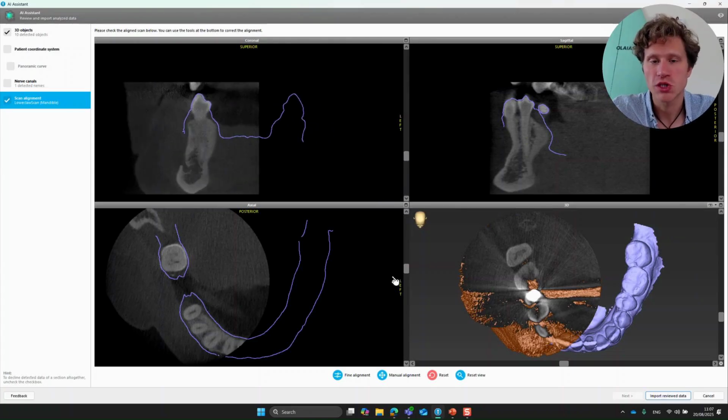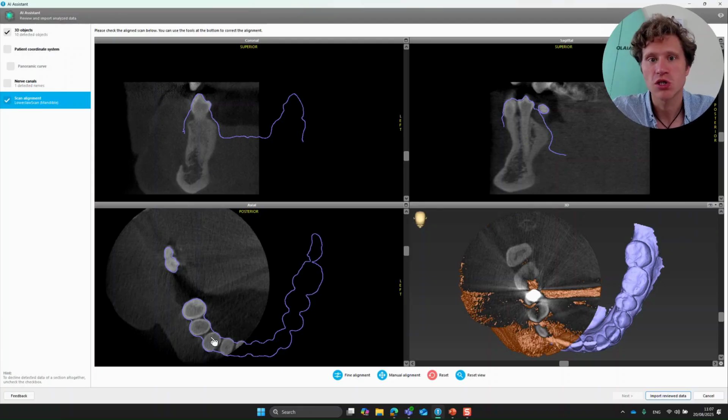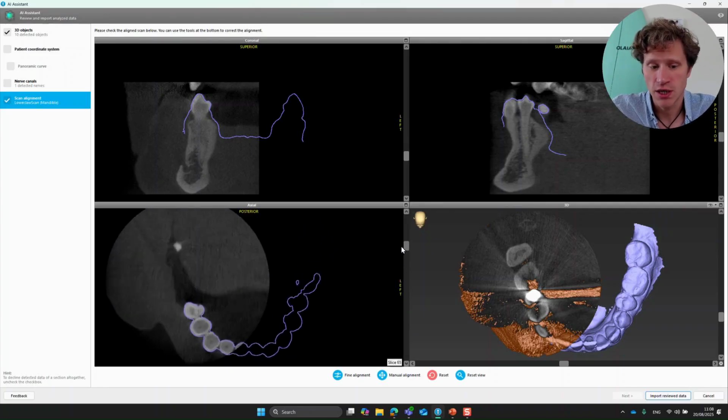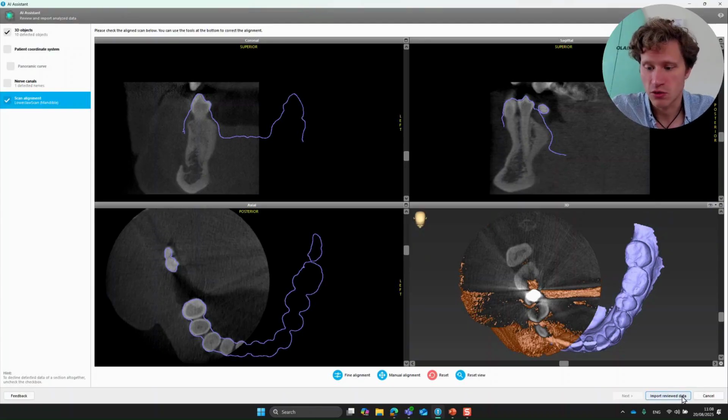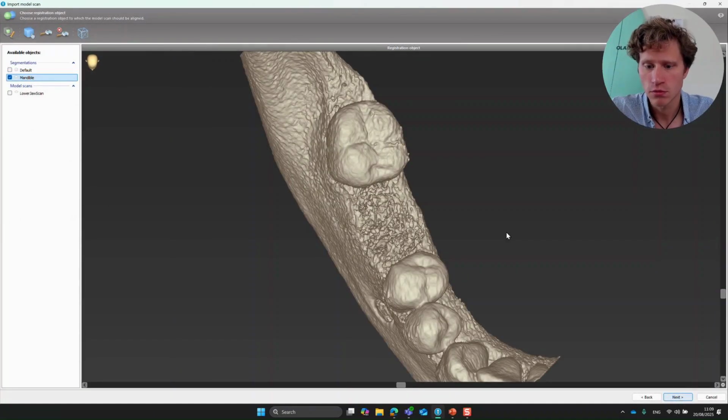The aim of the clinician was to make as low a dose as possible, and also for good alignment, he used high resolution of the CBCT. And what happens if we have a little bit lower resolution, if we use the standard resolution but a bigger FOV? Actually, there will be the same dose for the patient, but we will have a triangle for good alignment. Why? I will not trust this triangle. So we can see that alignment is okay. With the AI assistant it is really easy. Let's do this manually. I'll then look into the segmentation.